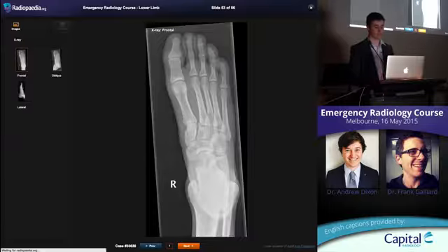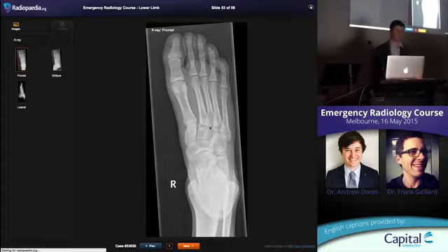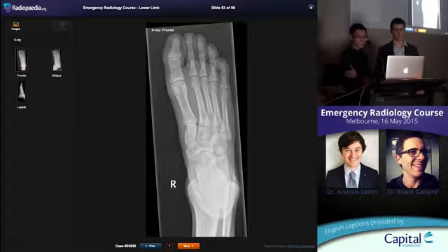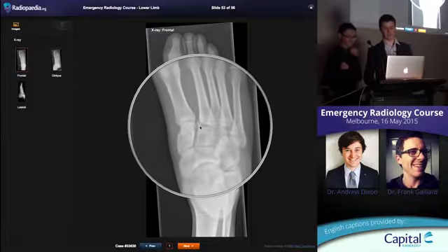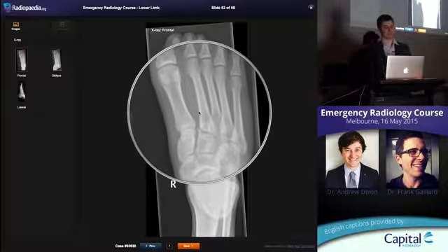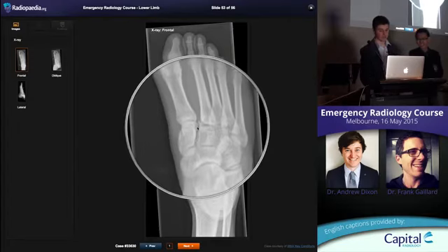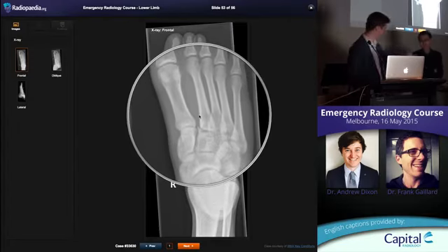And if we go back to the case here. I think there was a Lisfranc space over there, and then, yeah, that's pretty much it. Yeah, so excellent. You spotted it. That's the main thing. See that little bit of bone that's come off the base of that second metatarsal? Okay, and widening of that distance. If you follow this margin, there's a little bit of a step back to here. It's very subtle, but it's a very important injury. Take your prize.